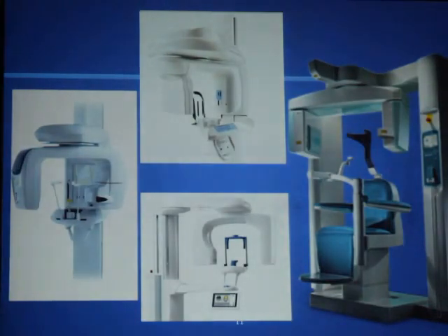So now, conebeam CT is a big machine. It looks like a panoramic machine, and different companies make it. In some machines patients sit, and in other machines patients stand, but it does not look any different than a panoramic machine. CBCT machines come in many types from many different manufacturers. Some use seated chairs, some use standing positions, but almost all of them look like a panoramic machine.